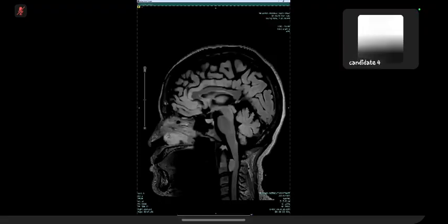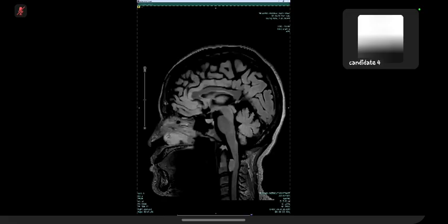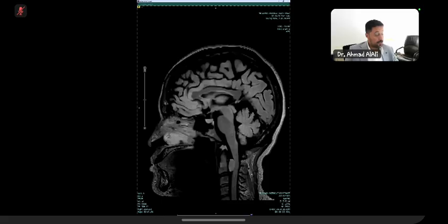Yes. In the provided sagittal images, I can see that there is likely an intradural extramedullary lesion in the anterior aspect of the proximal part of the cervical spinal cord at the level of C2. It is fairly isointense to the brain parenchyma. I do not see any internal cystic change, and I also do not see any evidence of low signal around the margins of the lesion. I would like to look at axial images to see if there is any extension into the neural foramen. The axial images didn't cover that area. It was outside of the brain, and the images requested were a brain MRI.